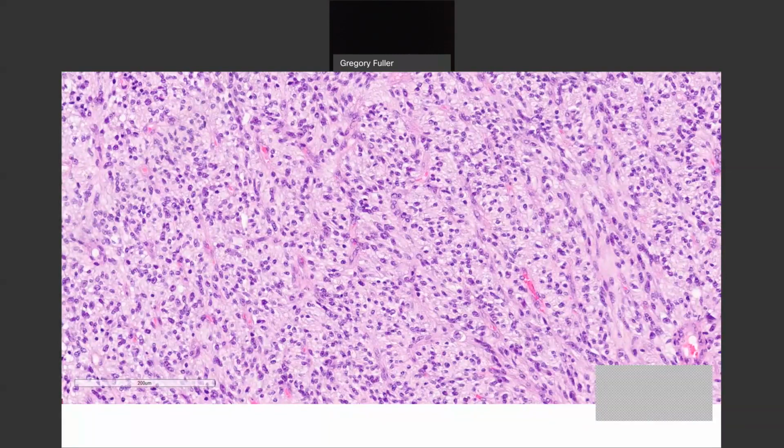Look at the cytoplasm, whatever you might be able to tell about the cytoplasm. Are there clarified or clear areas? Are there spindle areas? Are they eosinophilic? And so on. You look at the vasculature. What's the vasculature like? Is there vascular proliferation or not? The pattern, etc.